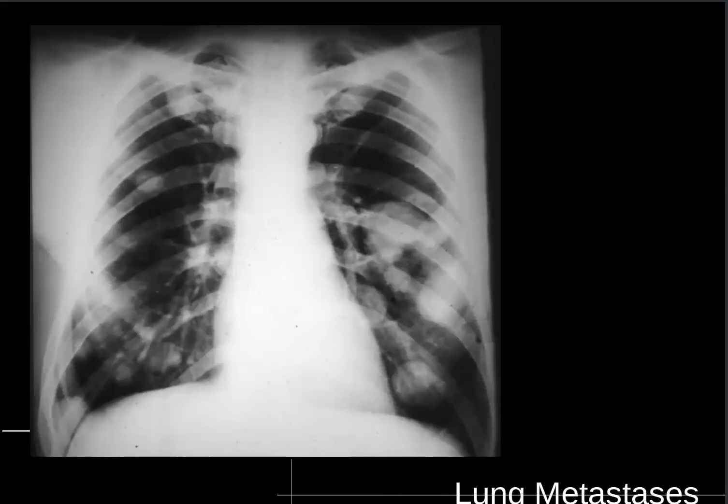So this is like the lung cancer we saw before, but there's lots of them, so well demarcated soft tissue lesions throughout both lungs. These are cannonball metastases, so multiple lung metastases. Again, they don't look like infection, don't look like effusions or pulmonary edema.